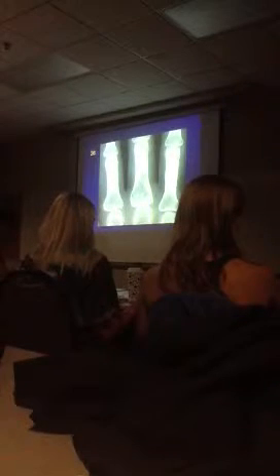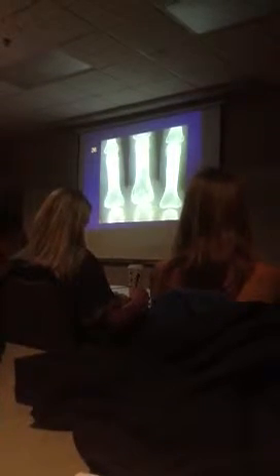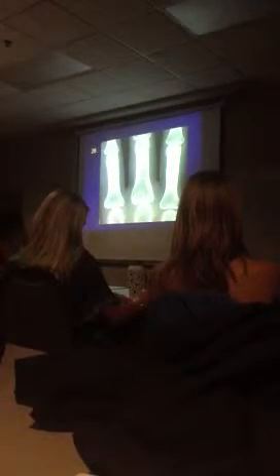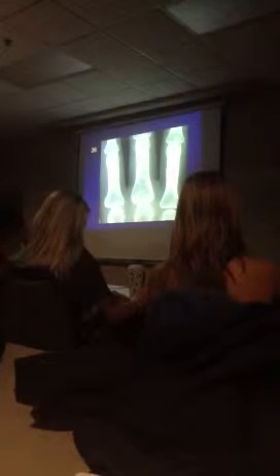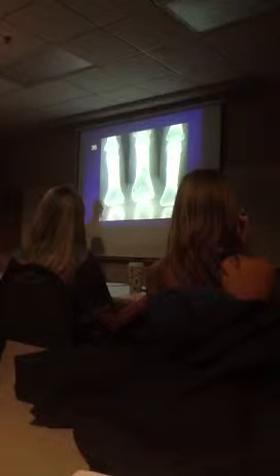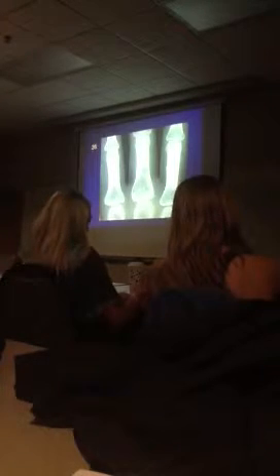So you have a short lesion in a short long bone, usually an enchondroma. If you have a long lesion in a long bone, it's usually fibrous dysplasia. So short lesion in a short bone, enchondroma; long lesion in a long bone, fibrous dysplasia. Also we see calcifications inside the lesion, and we see intact, slightly expanded cortex. By the way, enchondromas never have periosteal reactions. If there's a periosteal reaction, there's something else wrong.